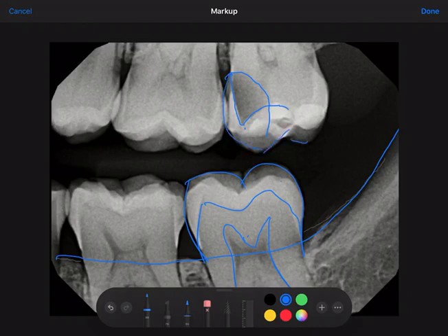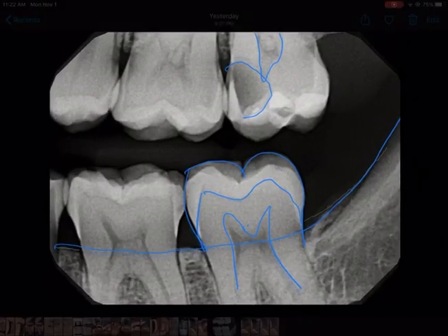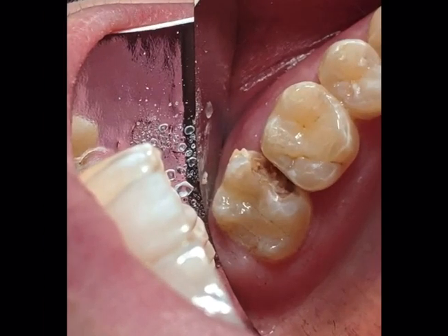so that makes it even more clear what's going on, which is when a cavity starts and it breaks through the enamel, it doesn't take it very long to start eating away at the part of the tooth underneath. And that's what's happened here, and that's why they're experiencing so much sensitivity, because the nerve is very, very close. Most likely it's already contaminated with the bacteria, and so it makes sense why they were feeling a lot of sensitivity.